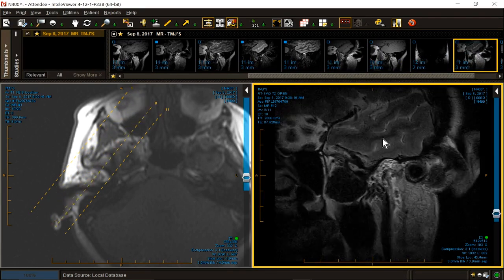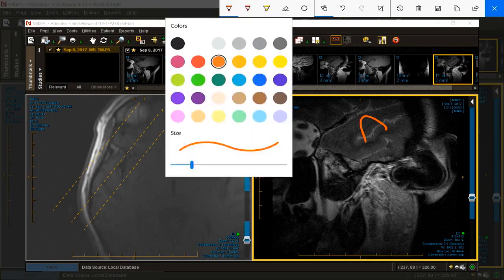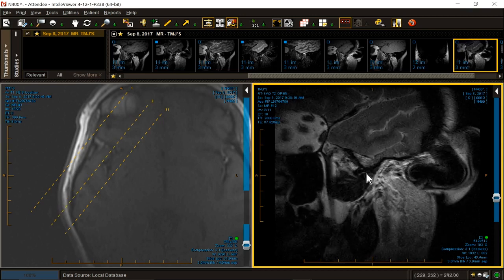It's a T2 open on the right side, and the meniscus should straddle. So it should look something like this. Sorry. And in a healthy meniscus, young person, I like to see about 60% behind here. So some of you are saying to yourself, okay, well, what's this? That is all scar tissue. That is all thickening of attachment tissue. The meniscus is over here.